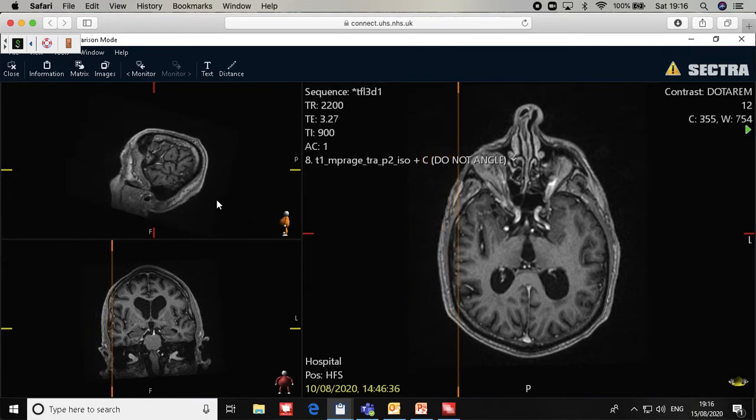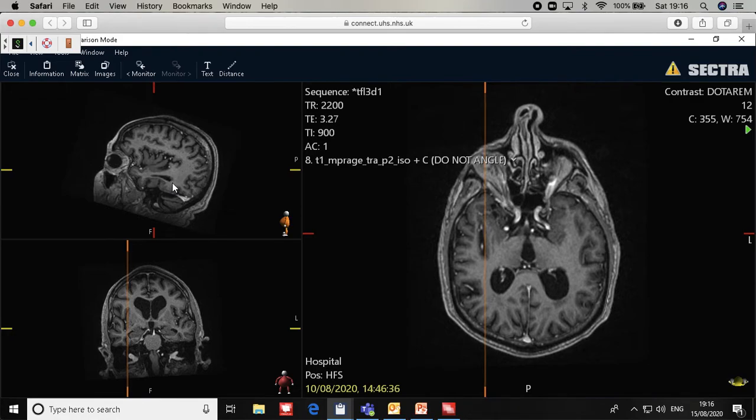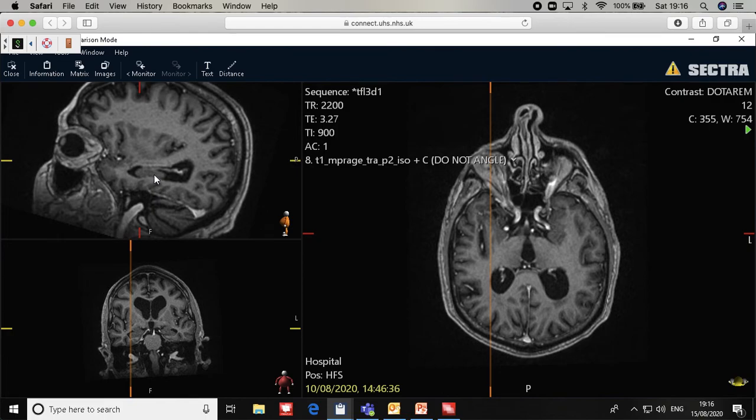Okay, look at the sagittal view with me. We are looking at it now. So it starts to appear. Let's magnify this a bit. Okay, the ventricle started to appear. I'm learning with you. Here we are, the gray matter started to appear.